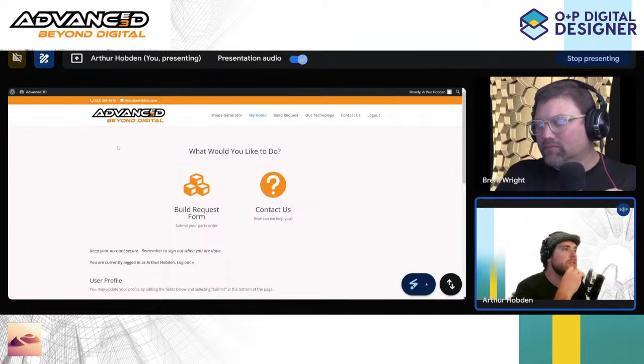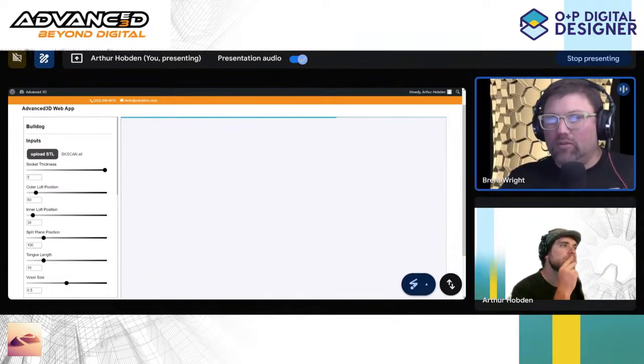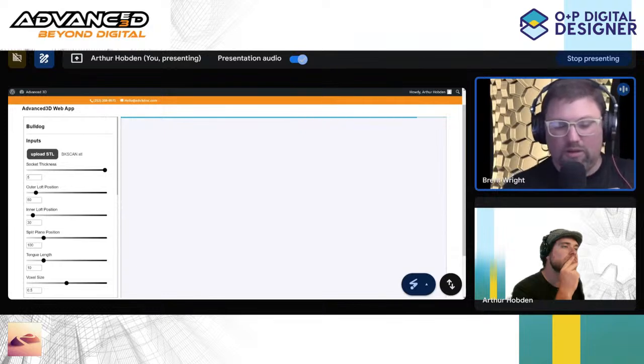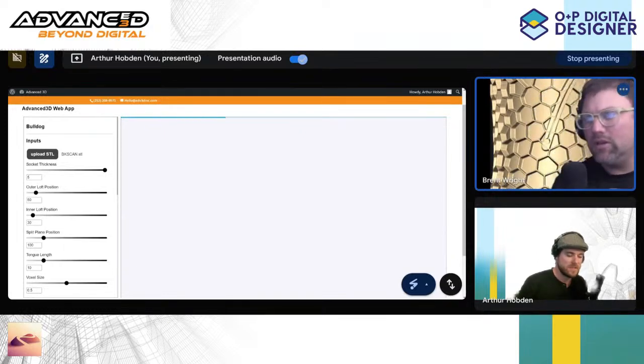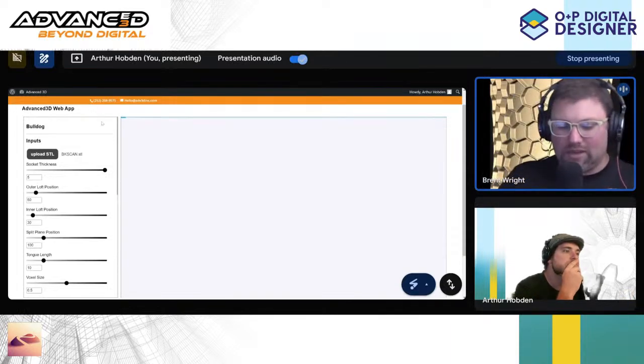So we're now on the Advanced 3D website, and I've logged into the user portal. This would be what you would see if you sign up. And if we go to the shape generator, this is the exciting automation we've been talking about this whole time. Just for those watching, right now we're in a state where we can speed up the processing side of things. We just haven't done that yet as we continue to prove this out. So usually it's about 30 seconds or so before the initial socket pops up.